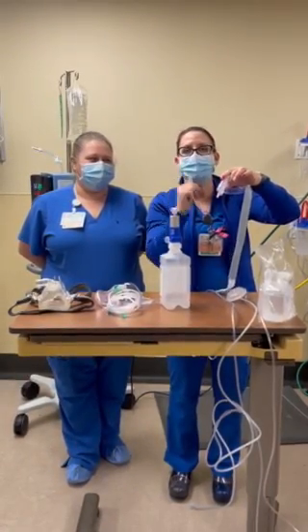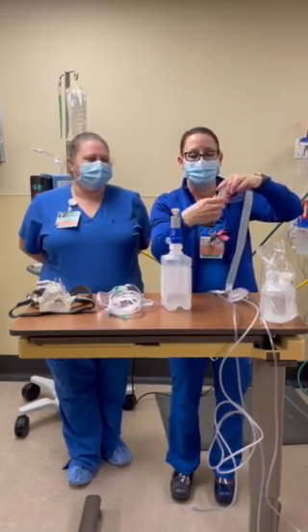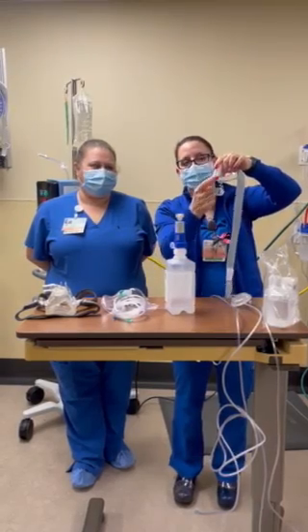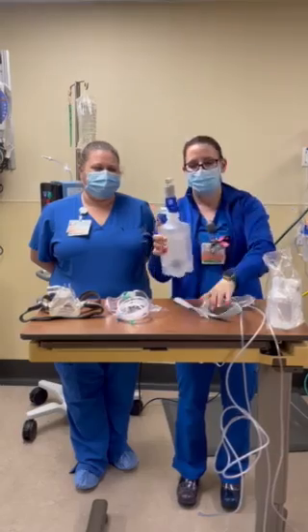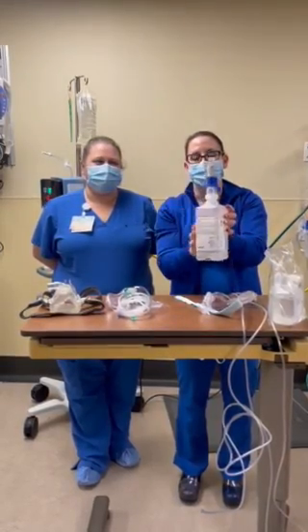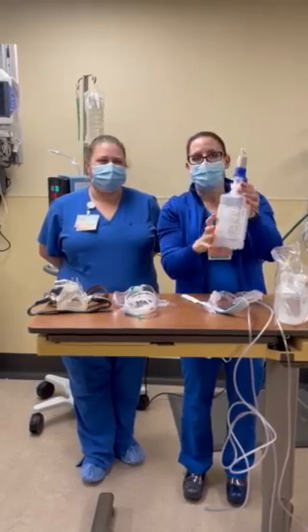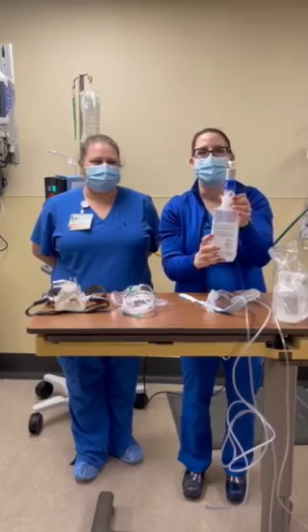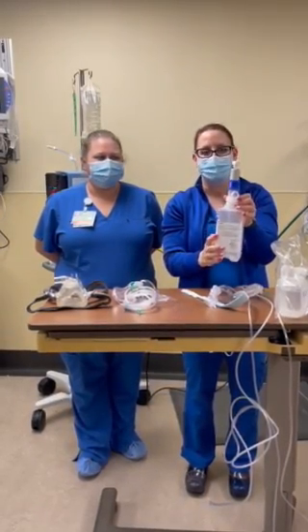What's great about this, the trach patient needs aerosol, they need moisture, humidification. Take off this cap right here, and you hook up the corrugated tubing right here. And then that would hook up to this water bottle here. This is screwed into the oxygen flow meter. Adjusting the flow on an aerosol trach mask does nothing to the oxygen content. It only decreases or increases your aerosol, your humidification, okay?